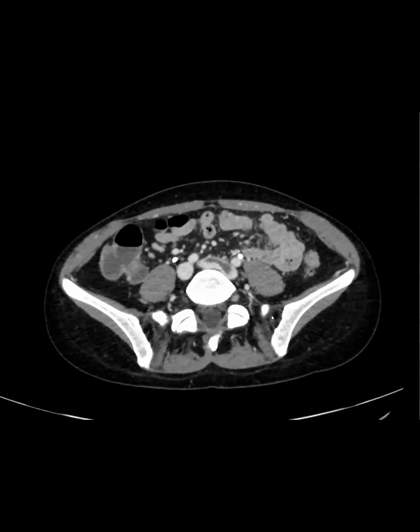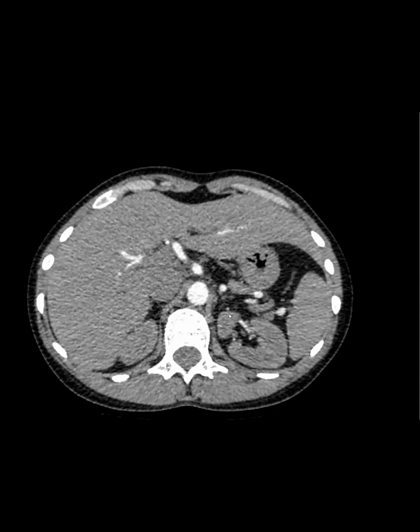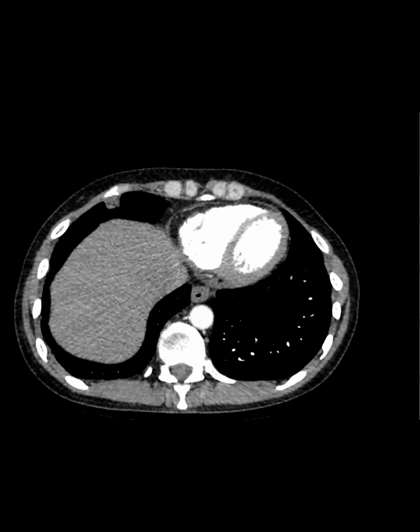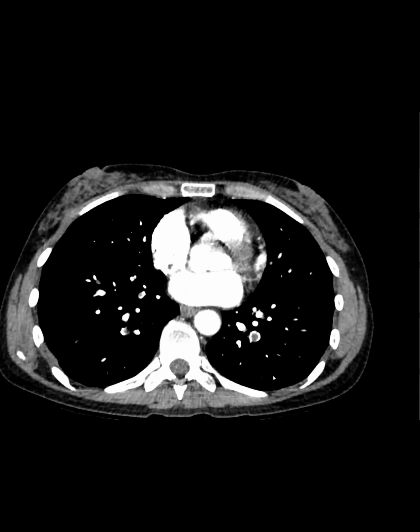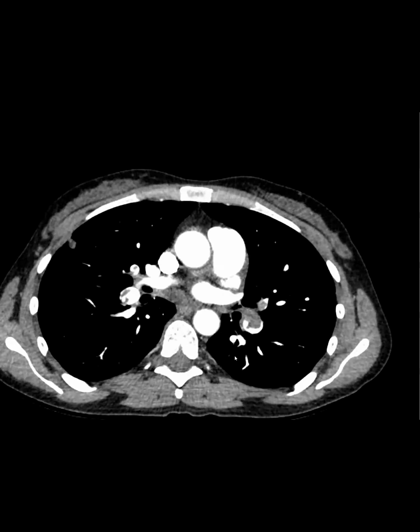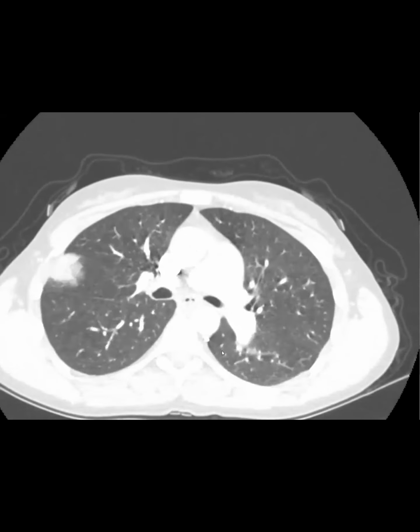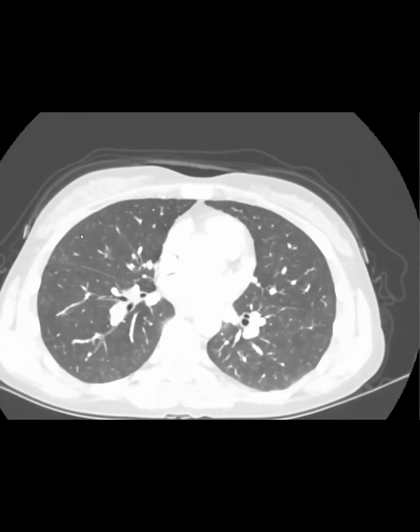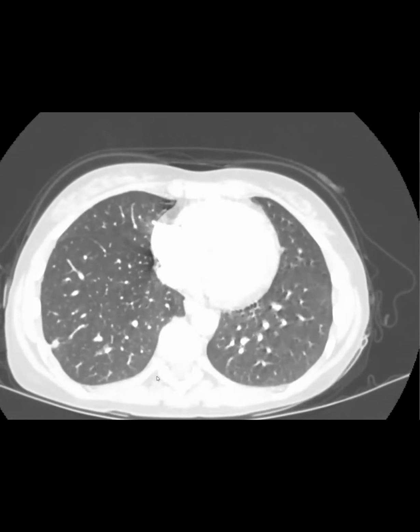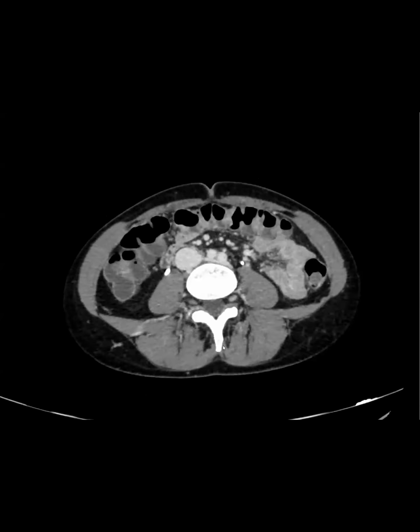This is where the venous thrombosis kind of stopped. And then this was the chest CT. So pretty extensive PEs bilaterally, and some peripheral little pulmonary infarcts. And then back to our abdominal exam.